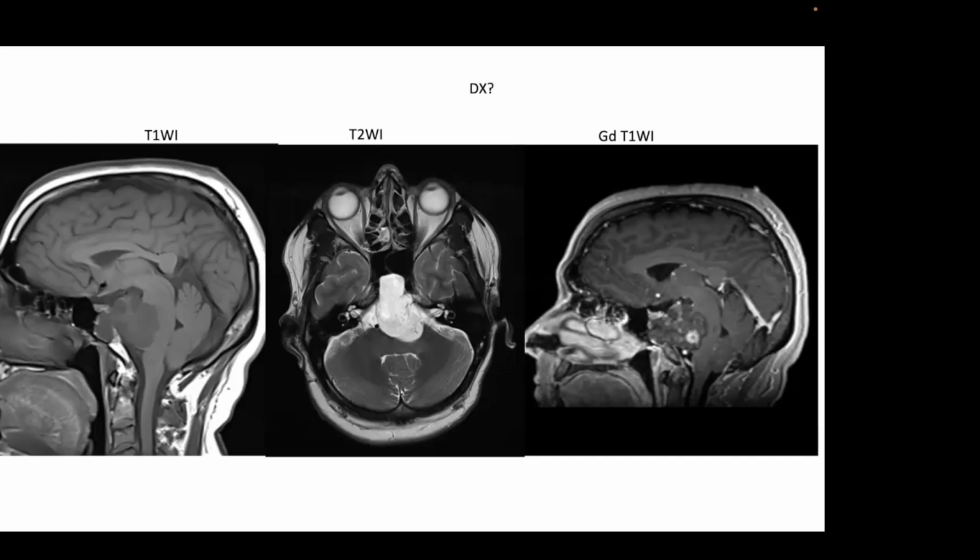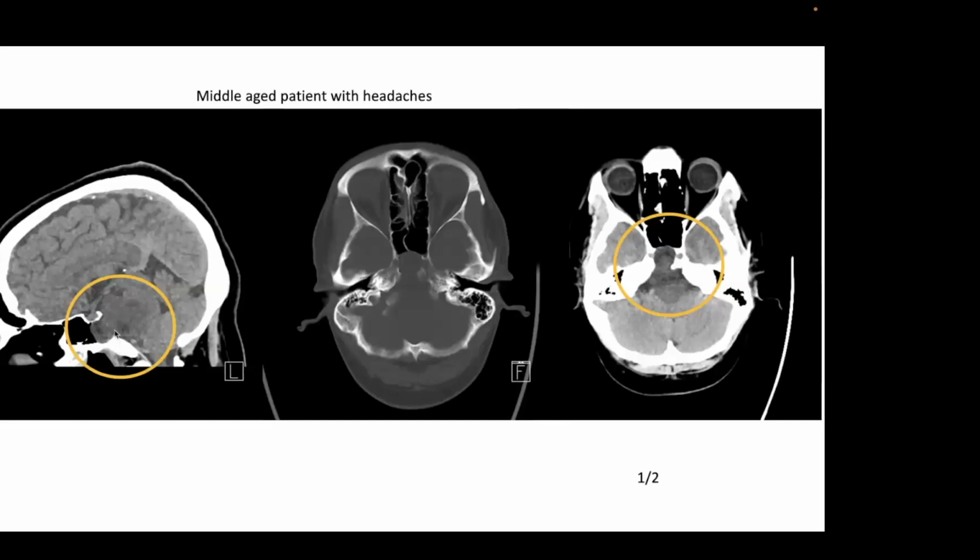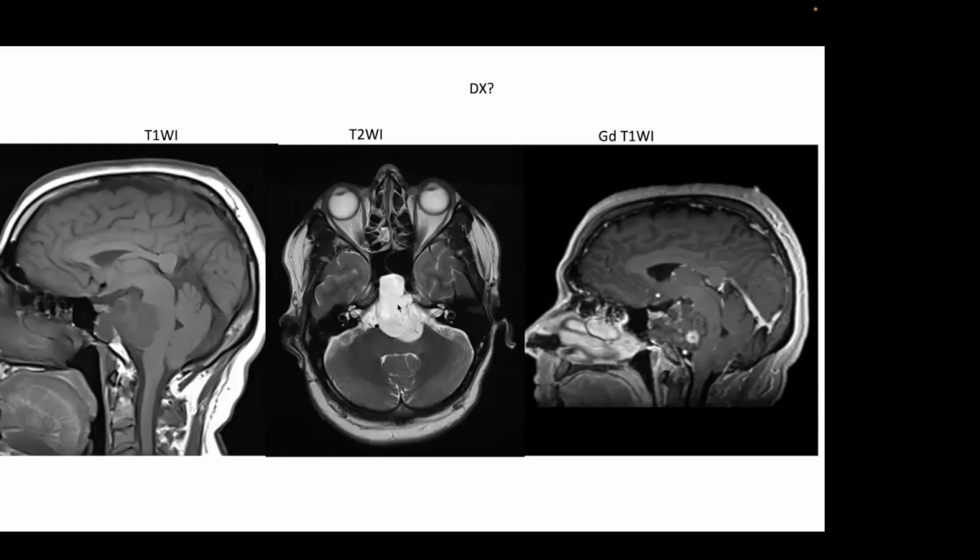Well, anyway, if we set infectious disease aside, which I think is always important to think about, this is a typical appearance of a chordoma. So it has two features that establish the diagnosis. Again, much like the other case, it's in the mid clivus, but there's true bony destruction in this case, not remodeling. And the characteristic feature of a chordoma is this kind of watery look to it. The chordomas have this profound T2 prolongation in them, and they usually don't enhance solidly. Now, these are malignant tumors in the sense they will grow and destroy tissue, but they tend not to metastasize.